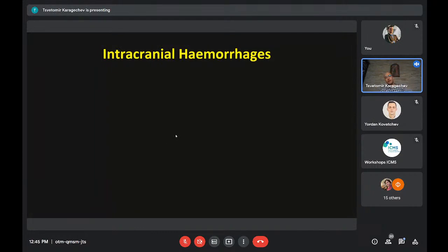So, intracranial hemorrhage, this will be the first part of my talk. Not only in neuroradiology, not only considering hemorrhages, but in all radiology, in order to be able to answer complicated questions like what is this, or the most complicated question, maybe why is it there, the very first question that you need to be able to answer is where is it? This is the basis of all differential diagnosis.